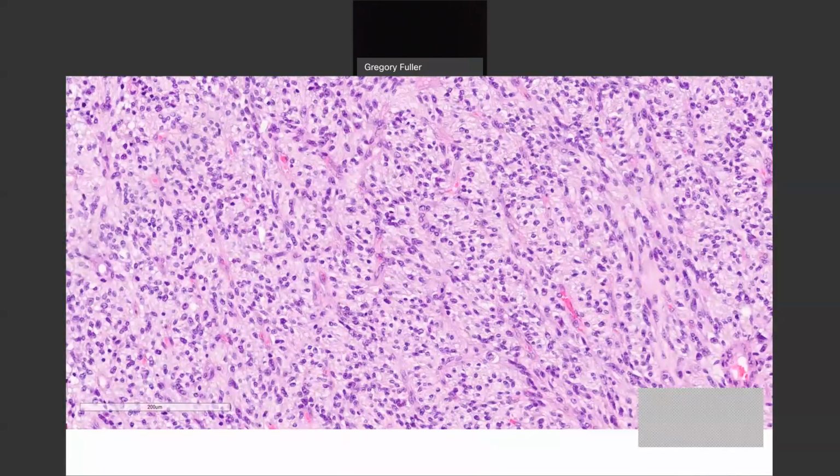The first thing I see when I look at this, it's definitely glial appearing. All of the tumor nuclei are very similar. The majority are round and monotonous. Some of them have halos. I definitely will entertain oligodendroglioma. Towards the right side of the field, they're looking a little bit spindly, so they're not all regular round. And now I'm thinking, well, maybe not oligo because they're spindle, maybe astrocytoma. But I'm just thinking about it.